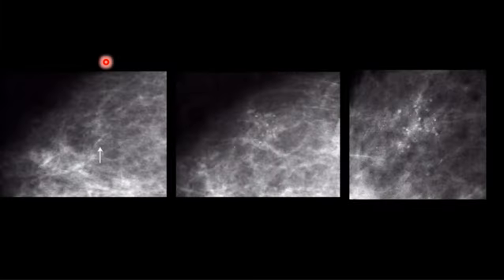I think we've seen that. Now, let's see another example. This is also high nuclear grade with central necrosis, craniocaudal view. This one, demonstrating low density punctate calcification. This might be benign, might be malignant, you don't know. If you have no old film to compare, you should follow it up. That's why the screening mammogram, if you're comparing with the old images, is of paramount importance. So important, very important. Okay?